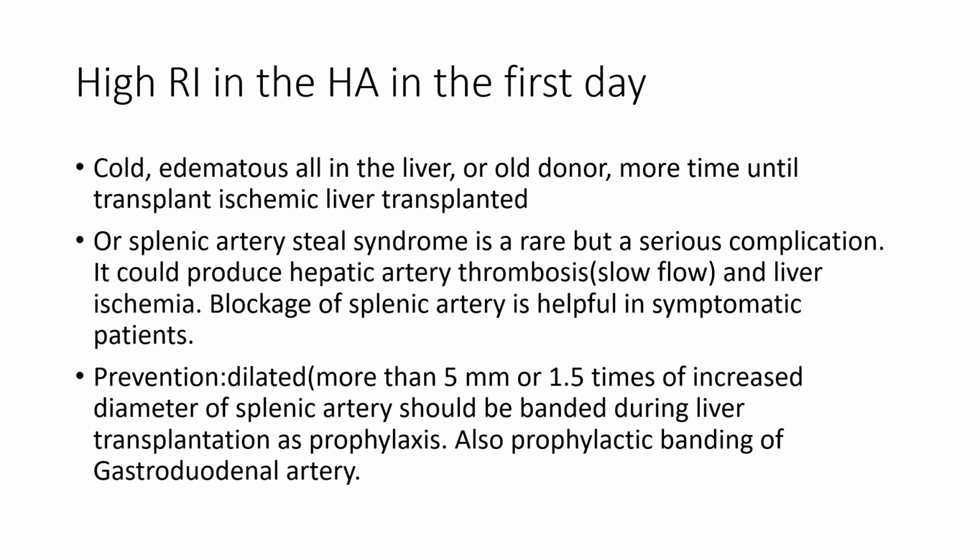Or we know here we have the celiac trunk, then the common hepatic artery here, and then the celiac trunk, left gastric, and then the splenic artery.